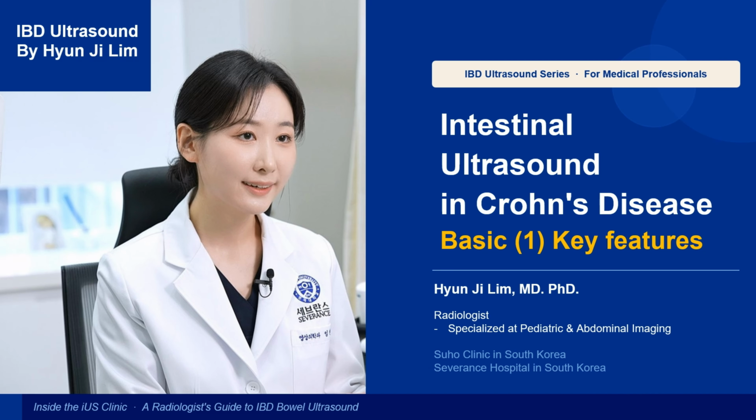In this video, Basic Part 1, we're going to cover the key features of intestinal ultrasound in Crohn's disease from normal bowel anatomy all the way to validated scoring systems. This series is designed for medical professionals. Let's get started.